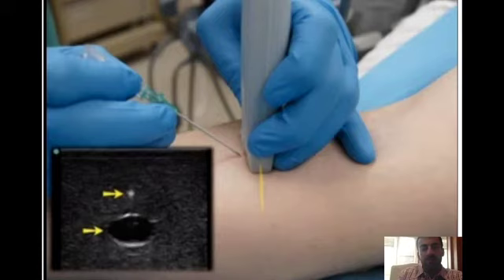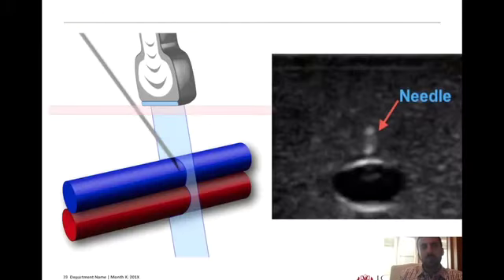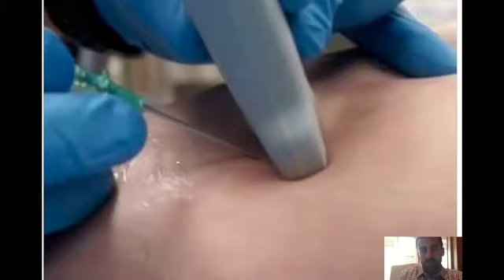When you hold the ultrasound probe, always think of what the ultrasound plane is, such that you can adjust this plane so that it matches your needle tip. So it is very appropriate to have this sort of positioning initially when you're cannulating, when you're entering the skin. However, once you enter the skin, you want to work on having your ultrasound plane much more along the side of the shaft of the needle. And so I'll try to show that in this cartoon here.